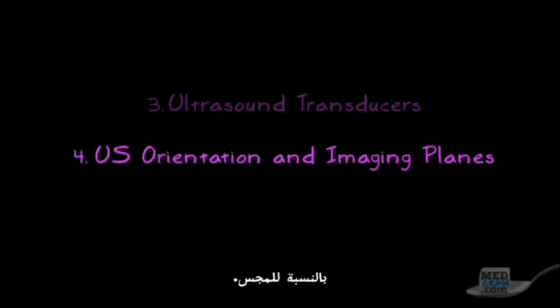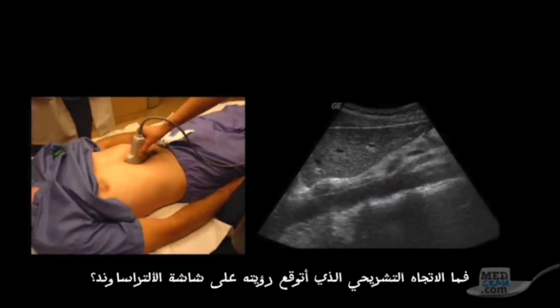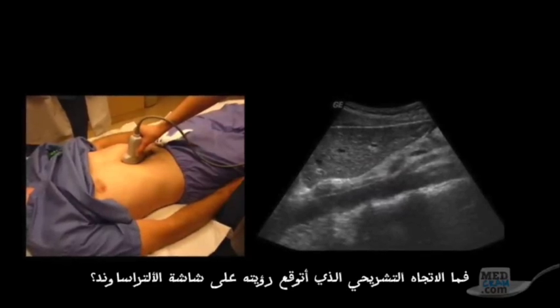Well, now that we understand the different types of ultrasound transducers, we need to understand the orientation of the ultrasound image in relation to the transducer. Or in other words, if I place my ultrasound transducer on a patient, what anatomic orientation do I expect to see on the ultrasound screen?